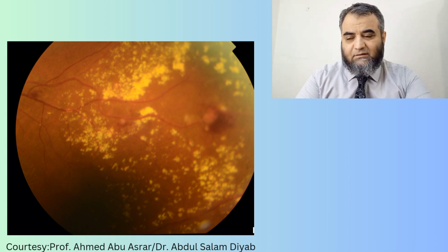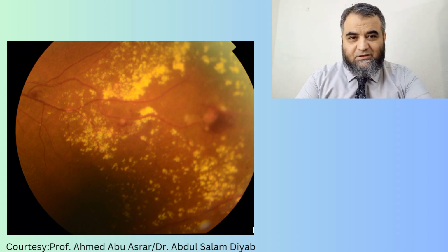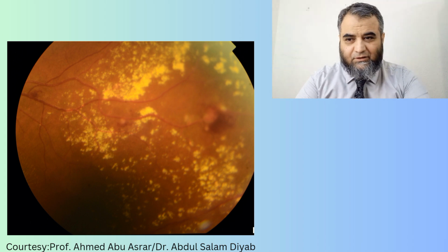This is a 35-year-old male patient who presented in the OPD with vision of 20/20 in the right eye and 20/100 with pinhole in the left eye. IOP was normal and the anterior segment had no significant findings. But on examination of the left eye, there were widespread hard exudates occupying the peripheral areas, with hemorrhages. So this is the first slide. Please have a look at this.